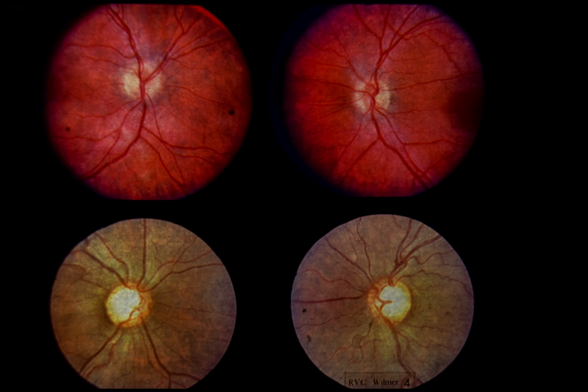Lower left and lower right. This 26-year-old male also has normal visual acuity and color vision, full visual fields, and consistently normal intraocular pressures. Both optic discs are normal in size, but the cups are large and circular and occupy approximately 80% of the total disc area. In each eye, a good temporal rim is present, and the peripapillary retinal nerve fiber layer is normal. We now leave the normal optic disc and begin our discussion of the pathologic disc.